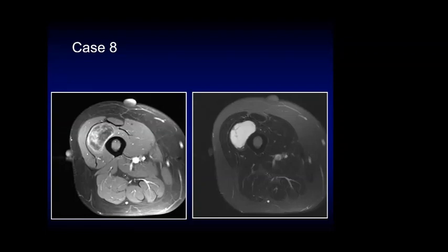Okay, can you do local staging? يعني location intramuscular, mostly intramuscular. Okay, which compartment? Anterior to lateral compartment. So which extremity is this?